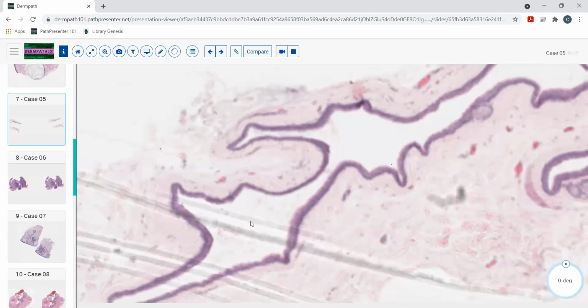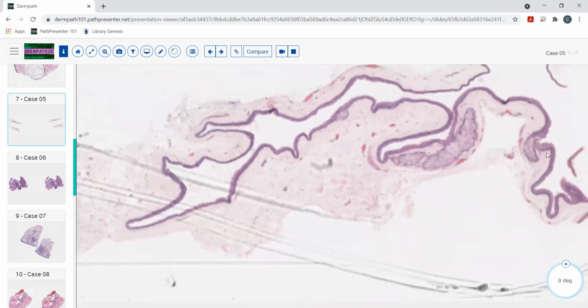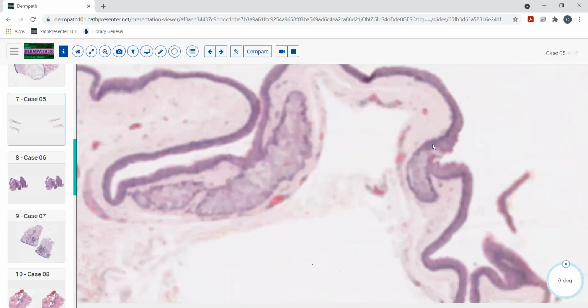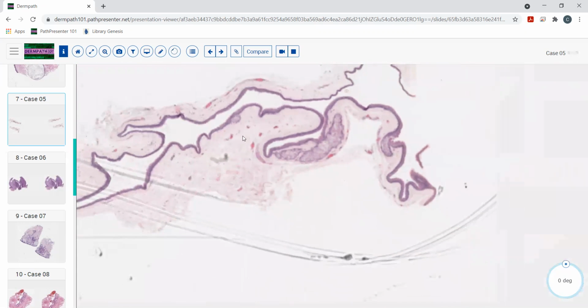Apologize that it didn't scan too well and it's kind of fuzzy, but you can see that it's got this corrugated thick cuticle, if you will. That's classic. Here's another example over here. Sebaceous lobule in the wall with the corrugated jagged lining that's got this pink hyaline, basically like a cuticle.